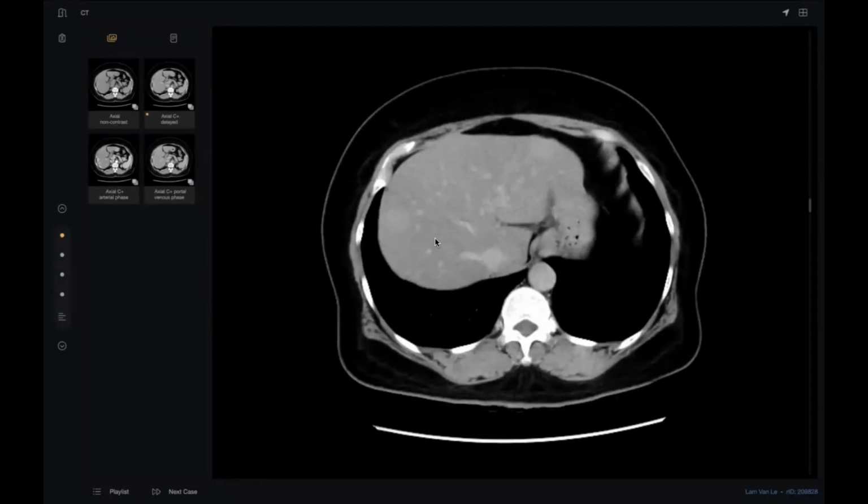I don't think they are malignant because this is right. So you are dealing with benign, non-aggressive, non-invasive lesions. Give me some differential diagnosis. Based on this appearance, the differential can be adenomas or hemangiomas, but less likely hemangiomas because all of them are showing very similar enhancement characteristics. What else?